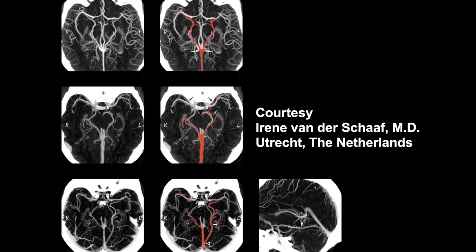If you look very carefully at the CT angiogram in these patients with perimesencephalic venous subarachnoid hemorrhage, and especially if the CT angiogram is a little bit venous, not infrequently you can detect some abnormalities in the venous drainage. For instance, in this patient, you can see that the internal cerebral vein, instead of draining in the vein of Galen, drains directly into the straight sinus. And that kind of venous abnormality is quite frequent in those patients, and they probably contribute to the pathogenesis of that condition.